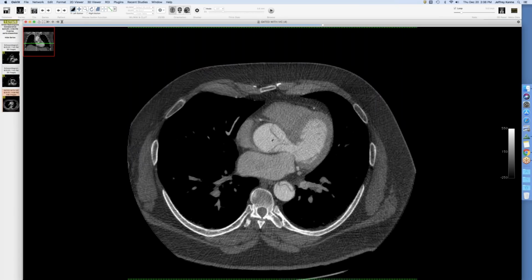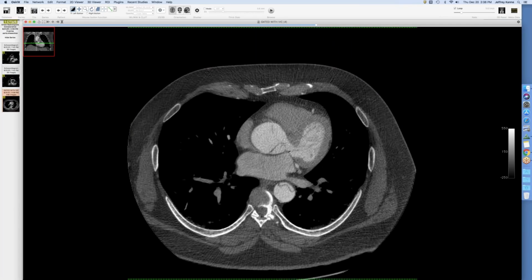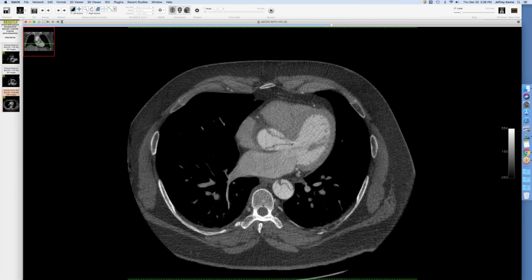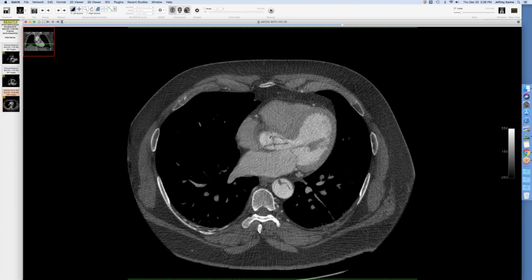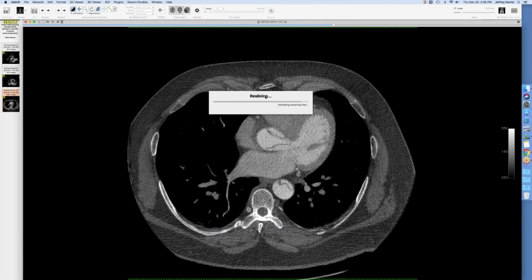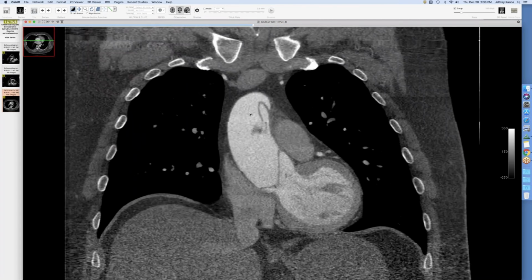Now, the aortic root is dilated here too, so I don't know if there's some pre-existing disease. And this one, the right coronary is small, so it looks like a left dominant system, but it also goes to the ostium, but not through it. And there's the valve plane right here. You put on a coronal too. Very interesting. So it's sort of intersecting backwards. Yeah. Just poking through right here.